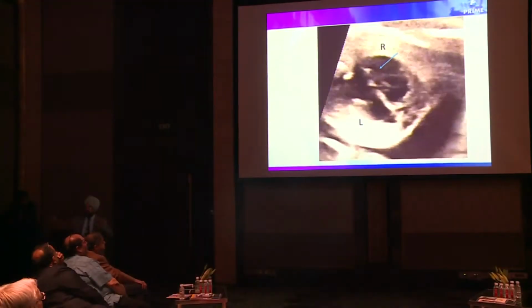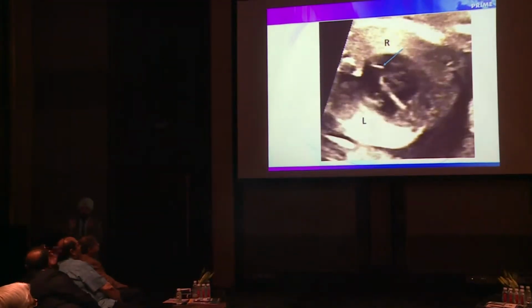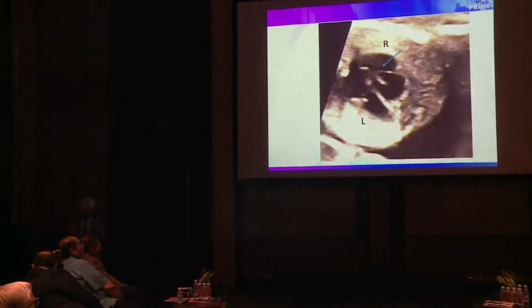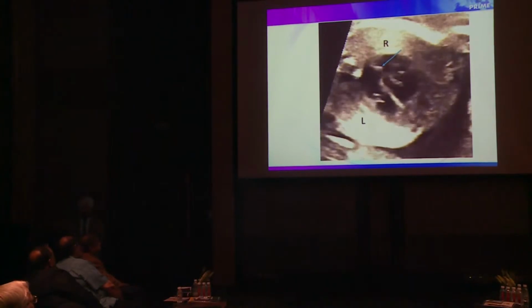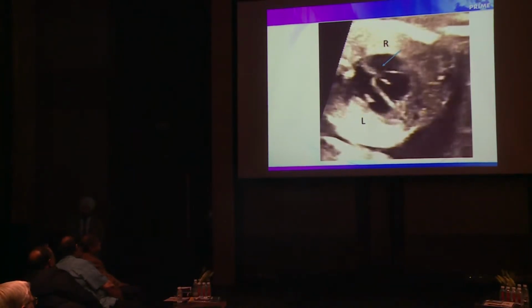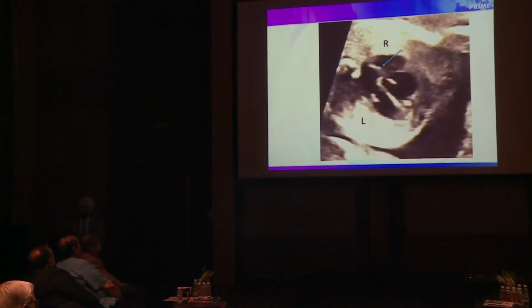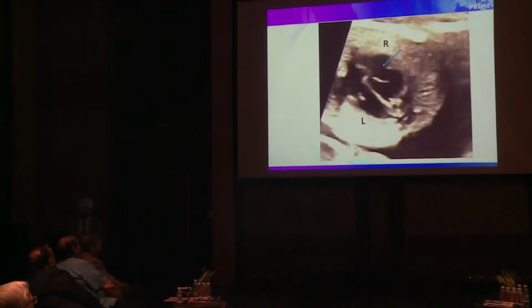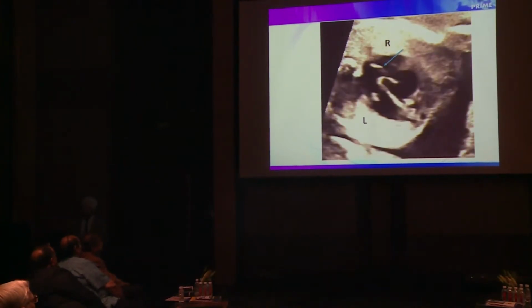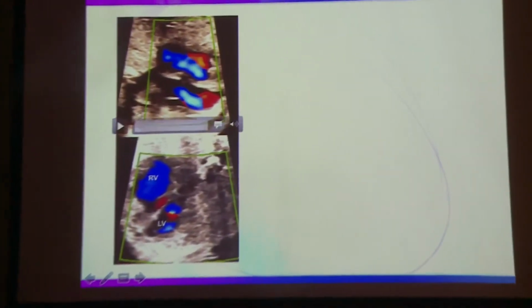to bulge on the right side. If the fossa in this case is bulging to the right side, that's the only clue. This indicates that something is wrong on the left side. Okay, what could be wrong? You can have a hypoplastic LV, it's not hypoplastic. You can have aortic atresia, there was no aortic atresia. You can have coarctation of aorta, there wasn't any coarctation of aorta. So then what was it? Look, the fourth chamber is looking okay, but let me tell you, fourth chamber is not okay.